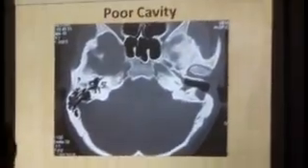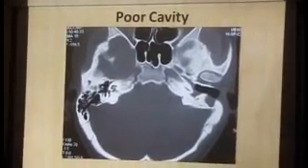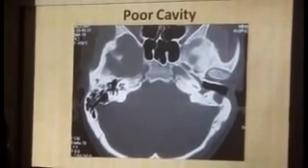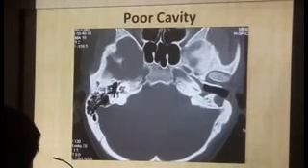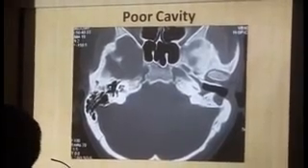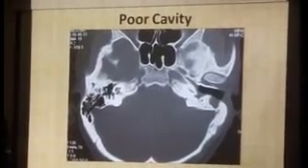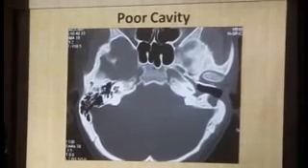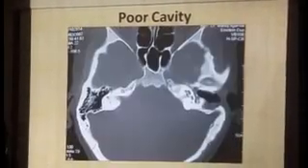Not only that, if you are going in as a secondary surgeon, it gives you the confidence that, okay, fine, there's a decent amount of bone on top of the facial nerve that I can remove before I should expect the facial nerve. And whether I can give a good cavity or not, if I remove this bone right up to this level, this line becomes more straight. So postoperative evaluation of CT for resurgery is a very, very important and effective tool.